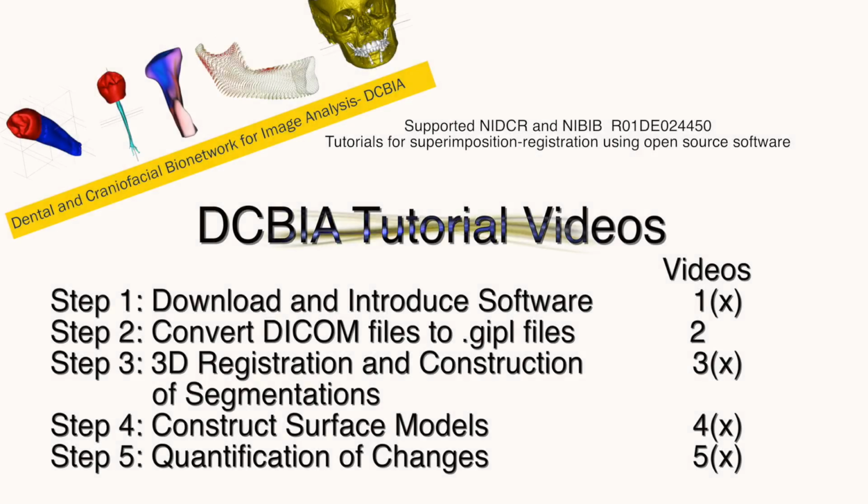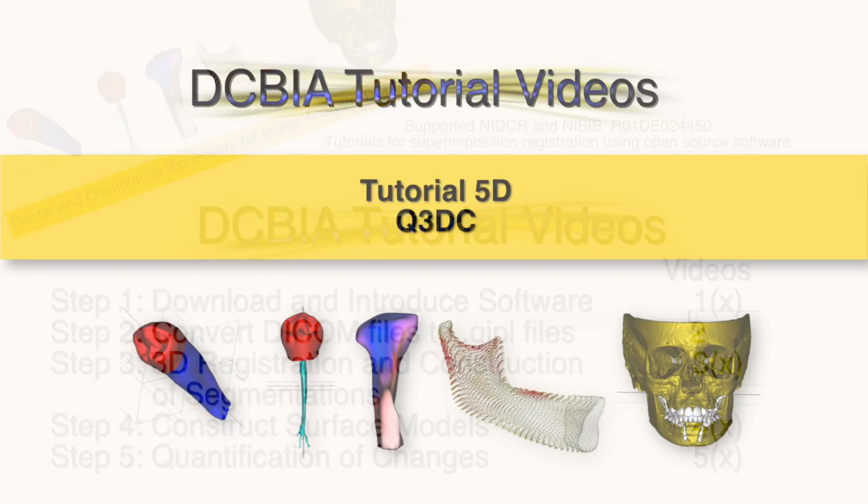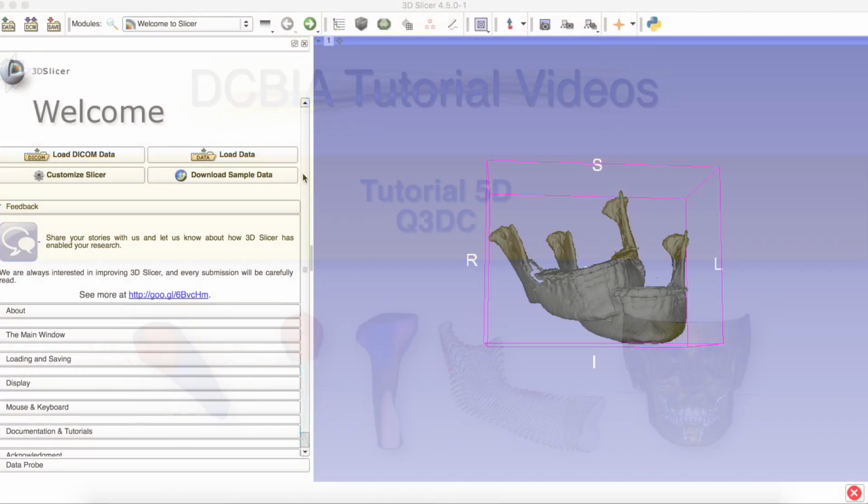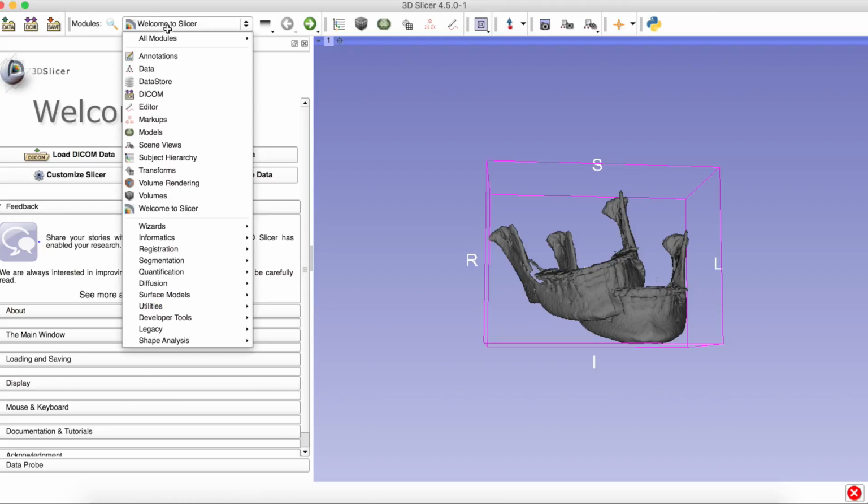We categorize this tutorial in step 5 of our sequence. This video is for Q3DC. It is a quantification tool for Slicer. To find it, go to the Modules drop-down menu, and it is located in the Quantification tab in Slicer.